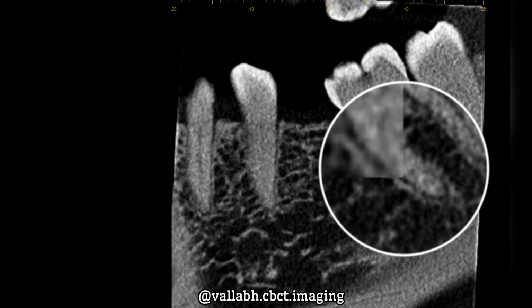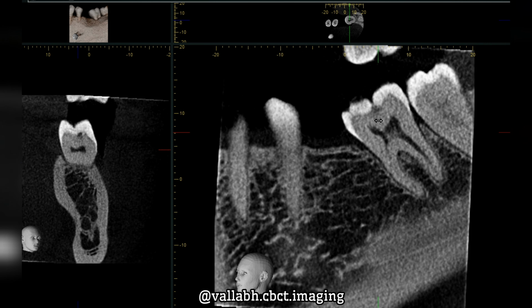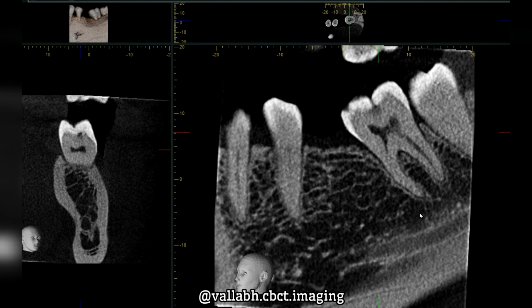The periodontal ligament space appears completely radiolucent in structure, and in cases of trauma or in cases of apical periodontitis, the space may widen. And in cases where the caries completely approach the pulp, the lamina dura may get lost and periodontal pathosis may be seen, which appears completely radiolucent.